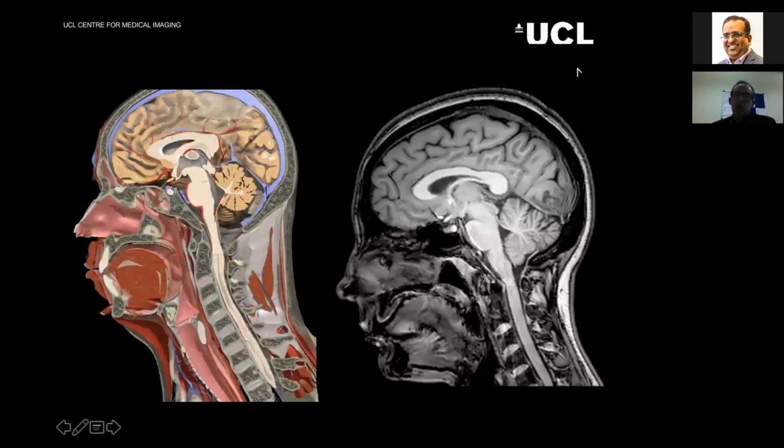And you're going to be looking at things like the dural sinuses, so a mastoid infection. Remember, mastoiditis is a clinical diagnosis, but the clinical history would be redness over the mastoid process. You look through, you can see that the mastoids are unilaterally opacified, and then you start looking at the bone windows, this permeative change, and they've got malignant otitis externa, for example, in an old person with diabetes.